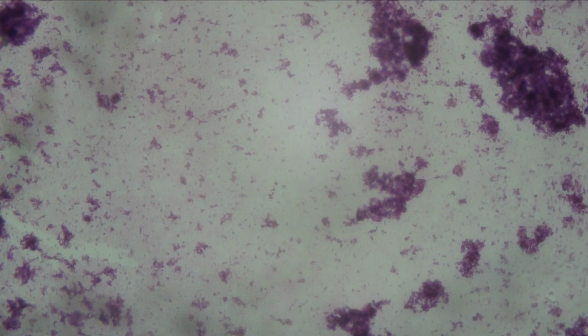cellular. So just while we have you, if this was a neuroendocrine or a pseudopapillary, what would we be seeing, Dr. Hassan? So neuroendocrine, lymphoma, and small cell cancer, you would see a lot of blue cells there. If it is a neuroendocrine tumor, you will see some cells which look like a fried egg, like yolk in the center or on the side, and you see a cytoplasm around. So that favors neuroendocrine tumor.